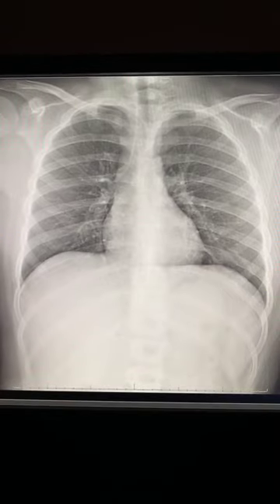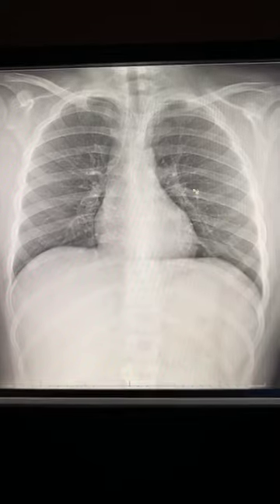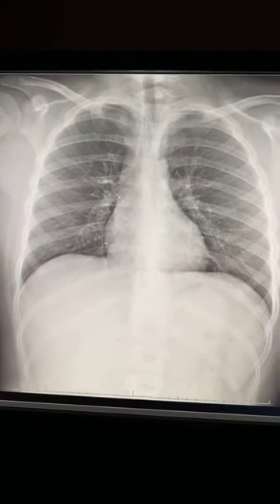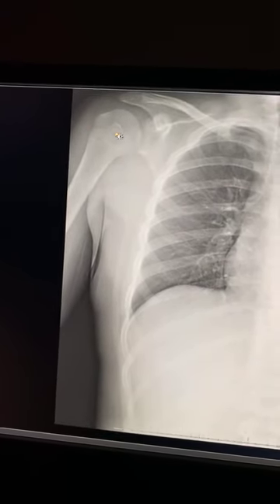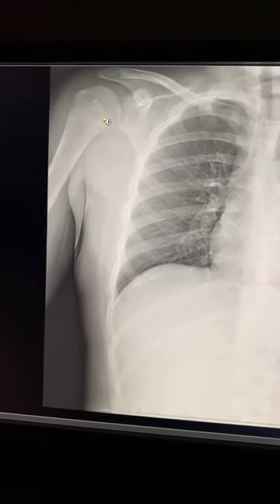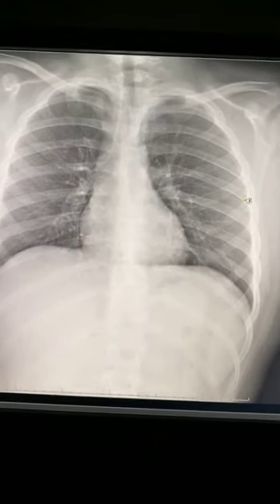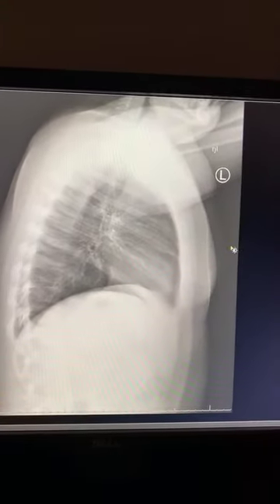And then the second thing that I'm gonna do is say roughly how old is this patient? What can tip you off about how old this patient is? I start looking around. Nothing too much is indicative around here, but then when I go to the bone, I see that these growth plates are still wide open. So I'm like, all right, this guy's not too old, not too young. I'll give him about a teenage status. And I look on the other side as well, same thing. So, okay, I'm looking at about a teenager right now. Probably, if I look over here, maybe a male patient. I don't see any breast tissue, but we don't know at this point.